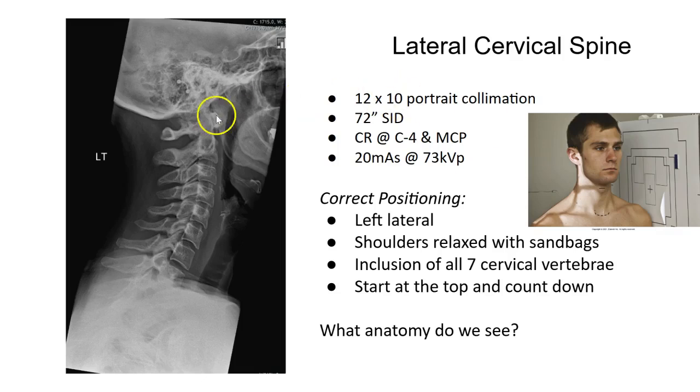So if you look at the curvature of the cervical spine, notice there's this slight curvature. And remember, that's a compensatory curvature. We're not born with that. That develops once we're able to hold our head up as an infant. And typically that starts about 6 weeks of age. In any case, because of that curvature of our C-spine, our vertebral bodies are angled slightly inferiorly.